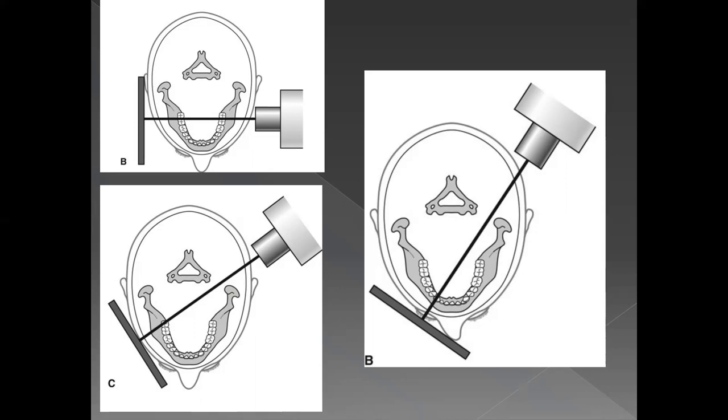Superimposition here means that, let's suppose we as maxillofacial surgeons are ordering x-rays to evaluate the midface and the mandible. However, there are other structures in that area as well, which won't let us examine those areas very clearly. Like the example I just gave, if you want to evaluate the anterior mandible, the problem is that you will always get the shadow of the cervical spine on top of the anterior mandible. So evaluating the anterior mandible on any plain X-ray becomes very, very difficult because of the shadow of the cervical spine. The cervical spine is superimposed, it is in your way, and that is why you cannot appreciate the anterior mandible very clearly. That is what I mean by superimposition.